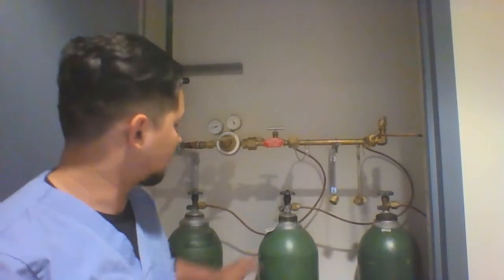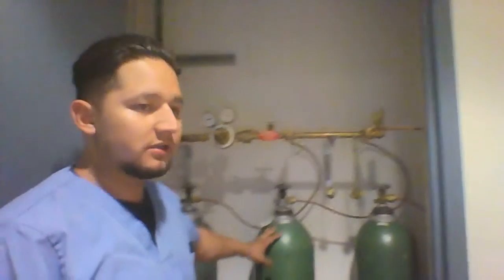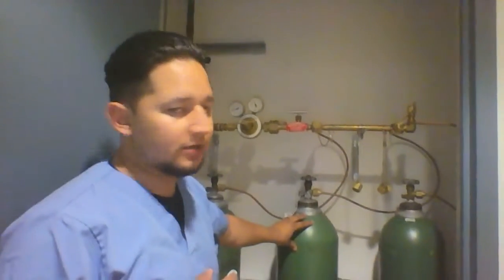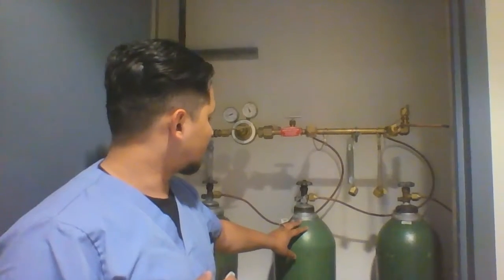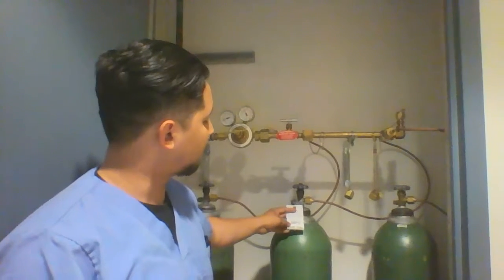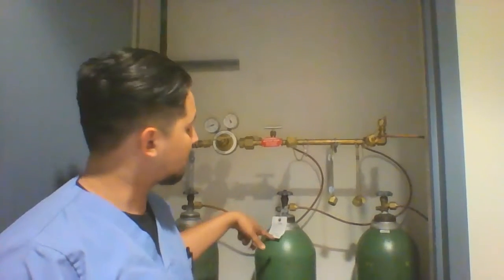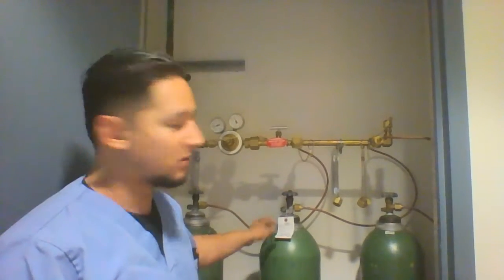Okay. So here at Pierce College, we have H tanks, which are housed in this little closet. Usually oxygen is contained in green containers. So we have a little system here that says partially full, full. When you activate a tank, you have to remove the full label so that everybody knows that this tank is in use.